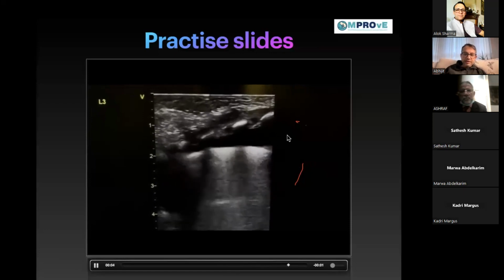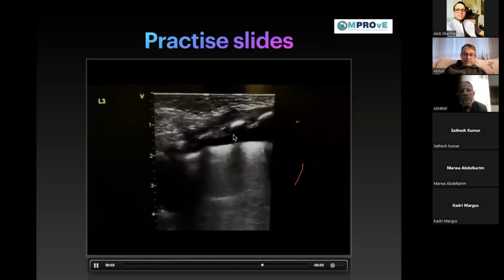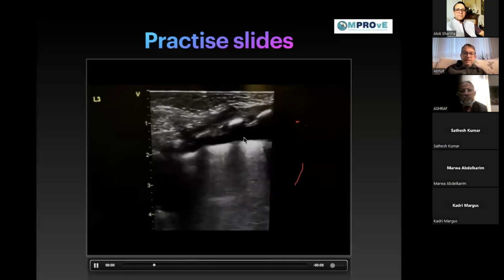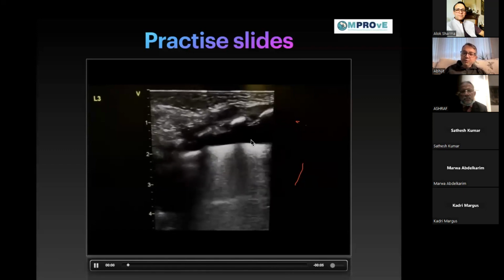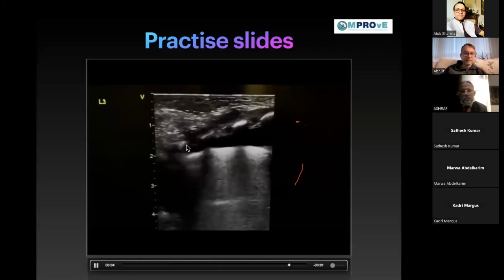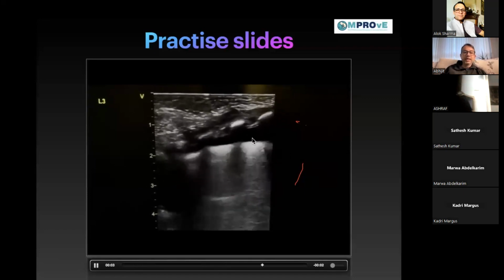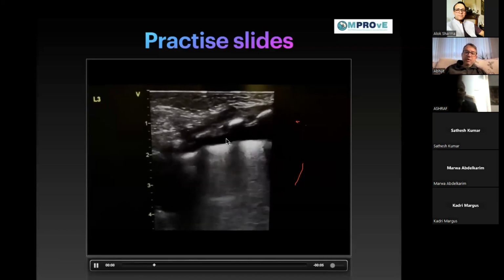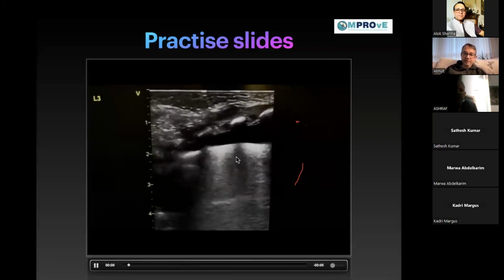So to answer your question, this is the slide. This is a baby with chylothorax. You can see it looks black. Chyle is white, but to ultrasound it is black because it is a fluid. So, a black area, anechoic. And you will see all the signs we have talked about in pleural effusion. At the end of the day, chylothorax is also a pleural effusion.